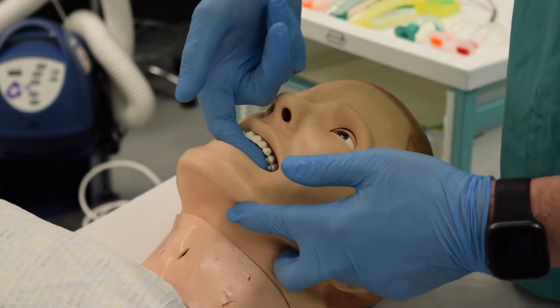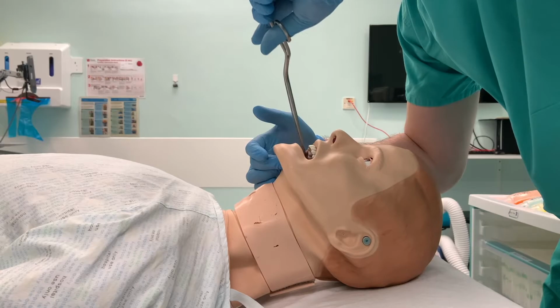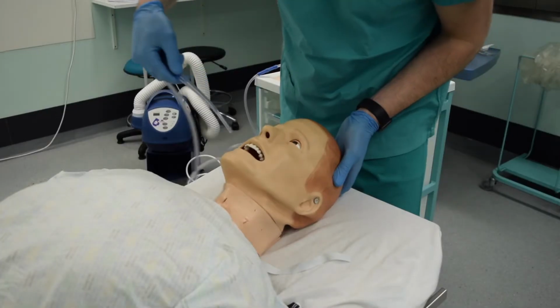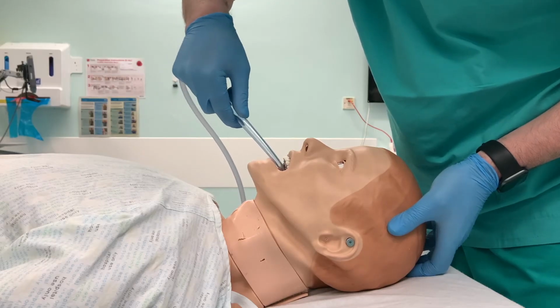If there's an obvious obstruction in the mouth, you might think of a single finger sweep to move that out of the way, or the use of McGill's forceps to carefully remove the object. Use only under visual guidance, so don't just sweep blindly with your McGills, and make sure to pick it out and remove it. If you're not sure or you can't move it, just move on. They can probably still get air past the obstruction. The use of suction can also be really useful if it's liquid or fluid, so blood or saliva, and you can use a Yankauer sucker to remove that.